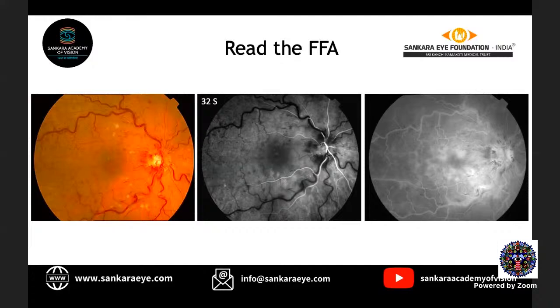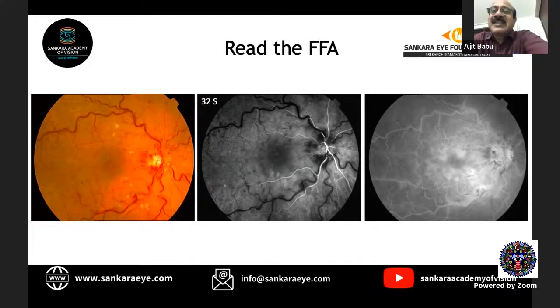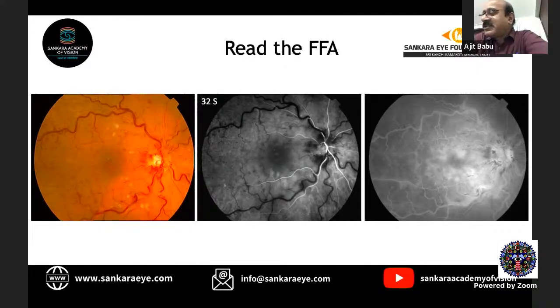Pradeep has written 32 seconds there. Okay, 32 seconds. Were you there in the last class? Then at 32 seconds, what do you expect on a fluorescein angiogram?